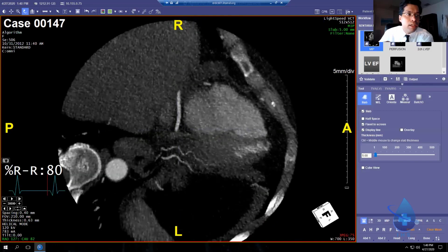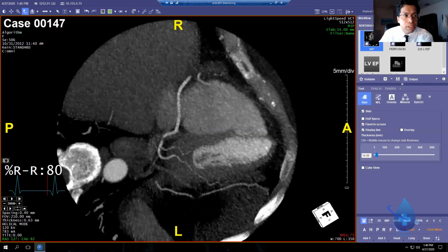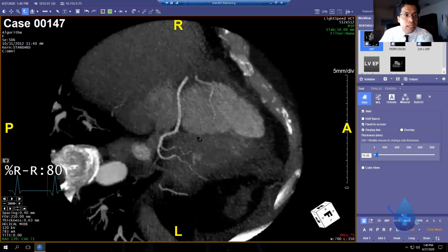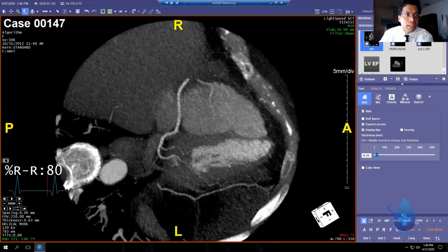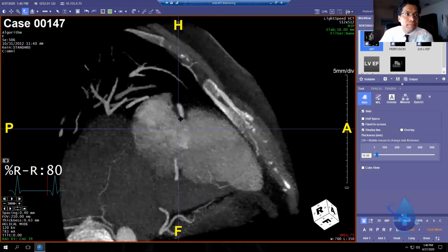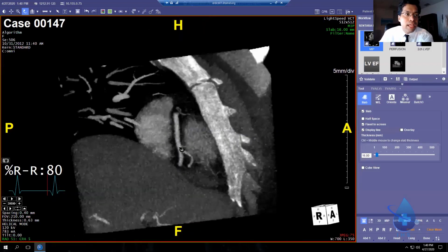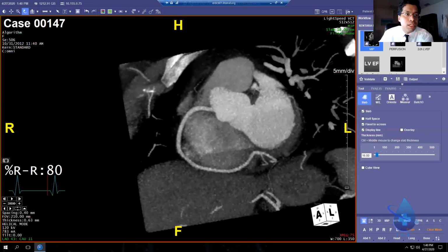And then here, you might have to cut in and out, and I might make the MIP slab just slightly bigger just to connect the vessels here. And that's the only view that's really not a traditional cath lab view, but it is the RCA. If I follow that back up in the right AV groove and turn it this way, you'll see that's what you're doing.